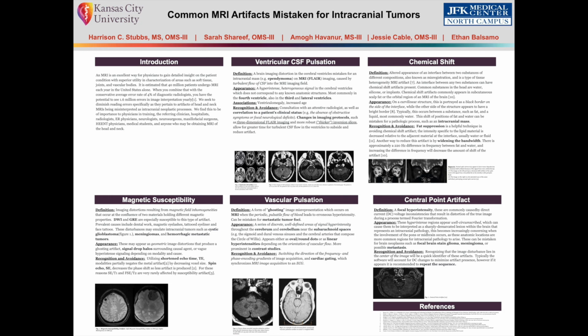Recognizing that the image disturbance lies in the direct center of the image will be a quick identifier of these artifacts. Typically, the software will account for direct current changes to minimize artifact presence. However, if it appears, it is recommended to repeat the sequence.